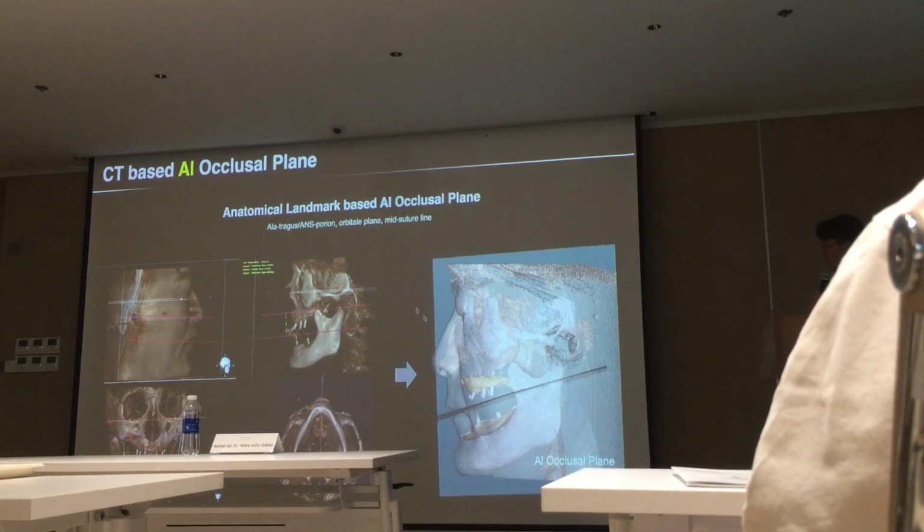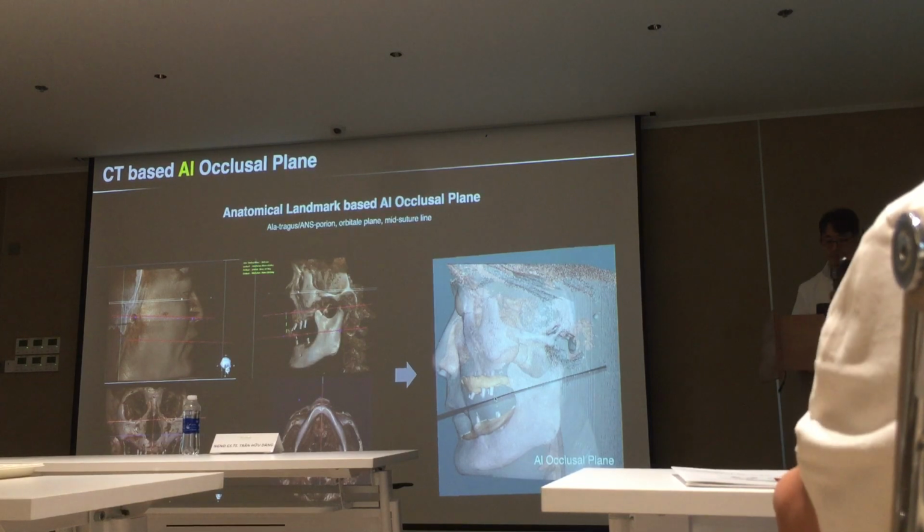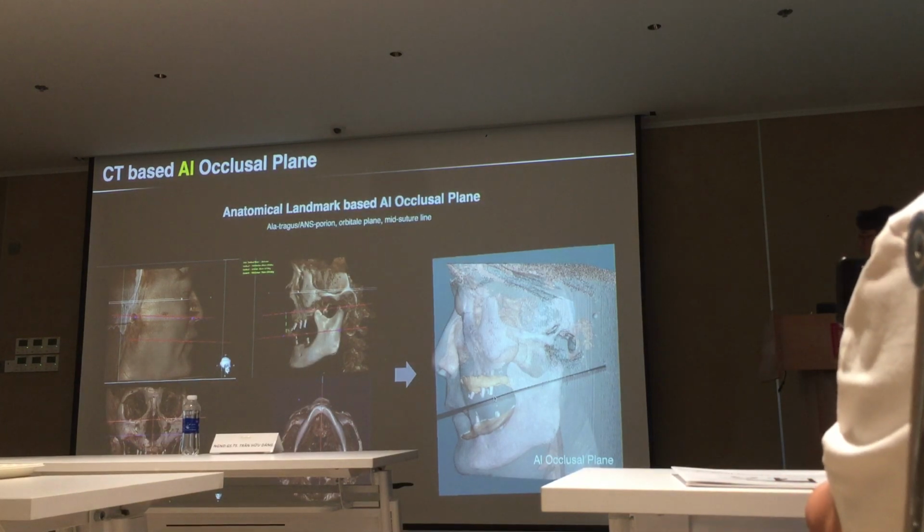So it automatically makes our occlusal plane, but it's not like 100% accurate, so you need to make a little bit of adjustment if you need to make some adjustment.